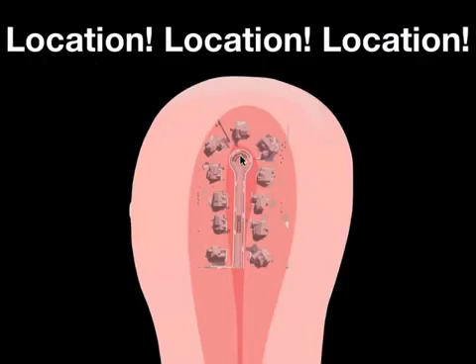And here you can see endometrial stripe, that's the road. Here's the endometrium. Here's where the houses are. They're not out here in the myometrium. They're not very close to the edge here. And you'll see in a little bit as to why that's important, but really take a look at where the pregnancy is implanted, because that's a key thing to understand and to look for.